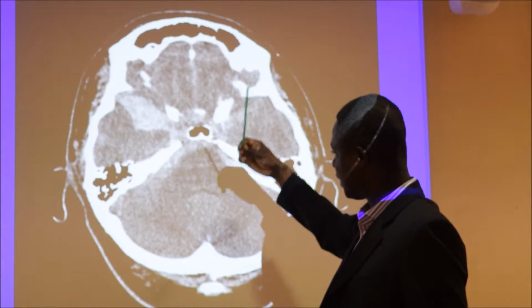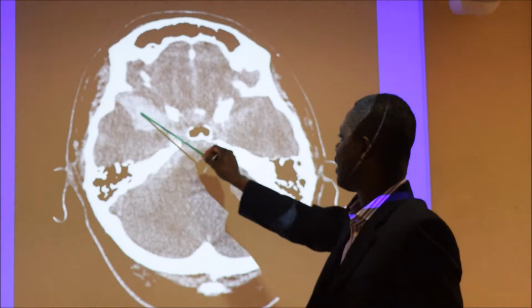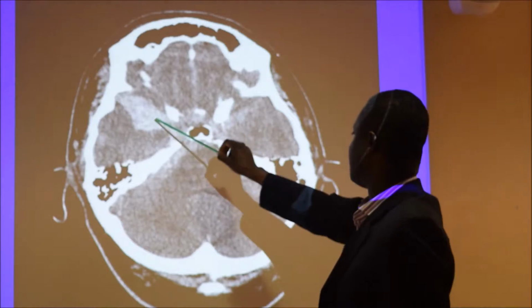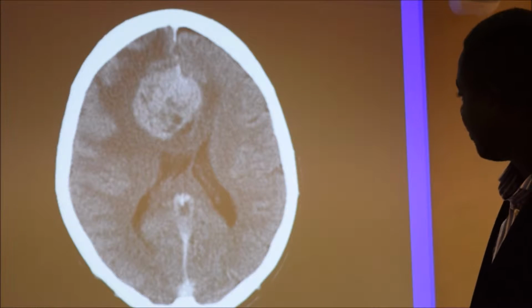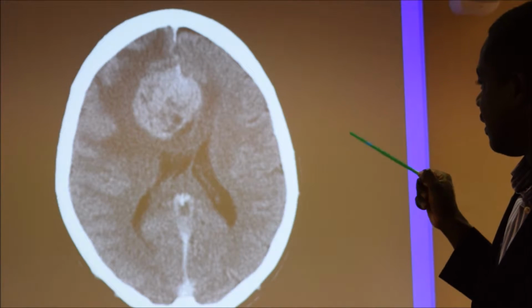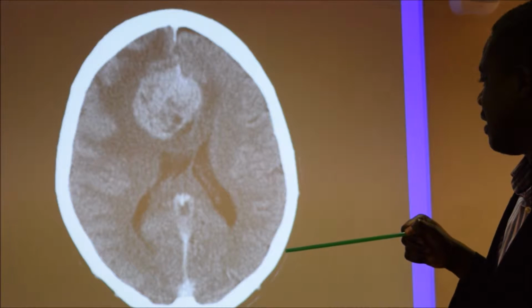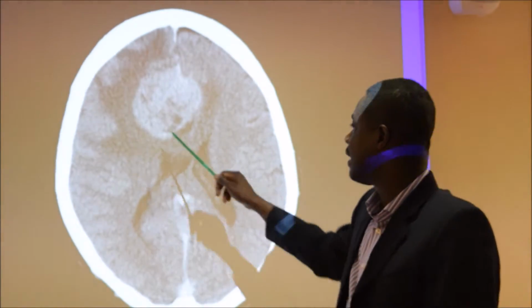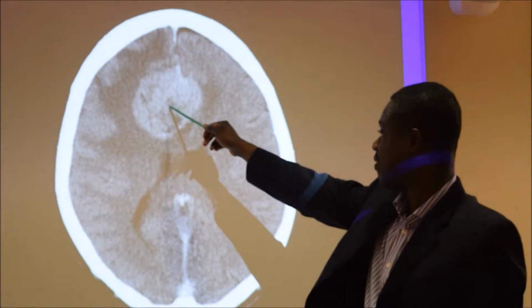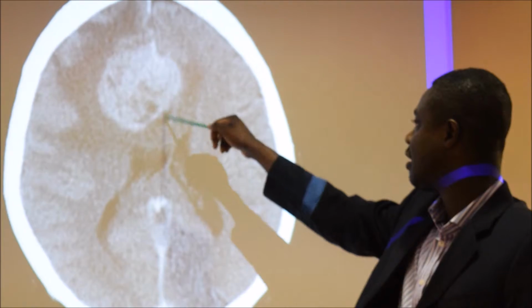So this is another patient bleeding into the brain, where you have increased density, this time in the sulci and in the fissures. And this is a case of subarachnoid hemorrhage. More different densities. This time the density is actually within the brain itself, and this is a patient with a brain tumor. We've given the patient some IV contrast, and the contrast is being taken up by the tumor preferentially. And you can see that tumors start to move structures around, the ventricles are moved around.